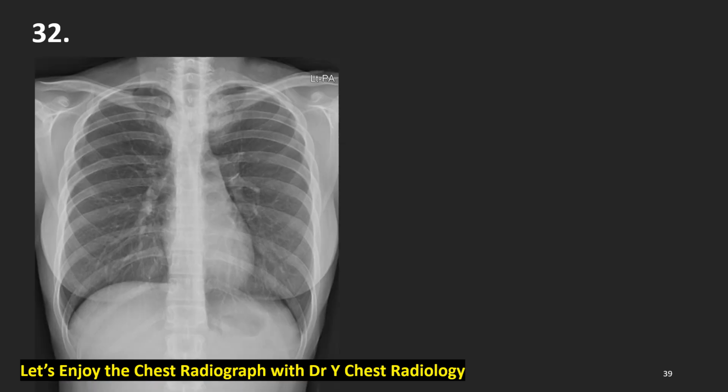This is a young woman's chest radiograph. She has nothing abnormal, no symptoms. What do we see? Yes, we see about a 4 centimeter density in the left apex or posterior superior mediastinum or paravertebral mediastinal compartment, which is continuous to the neck outside of the thorax.